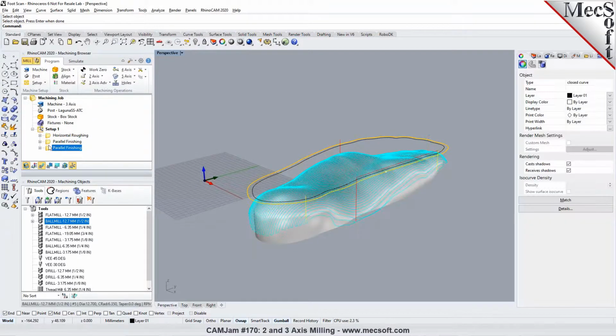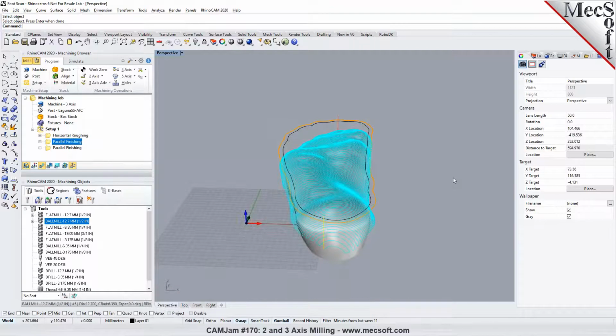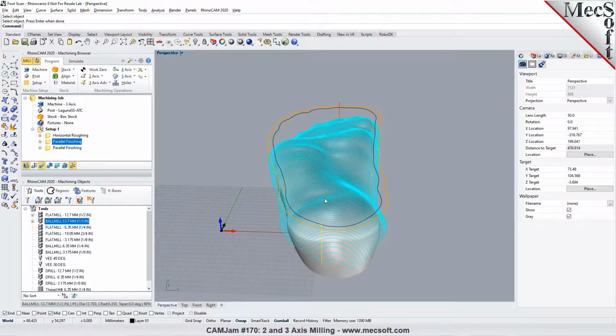Obviously we can speed that up and make it a little faster, right, than 28 minutes. Absolutely. Yeah, I'm looking to average more around, per pair, maybe 5-6 minutes if possible. Absolutely, you should be able to do it. 600 millimeters per minute is significantly slow for orthotics. I just used the feeds and speeds that are in my tool library, so I haven't fine-tuned it for orthotics. Okay. All right. Yeah.